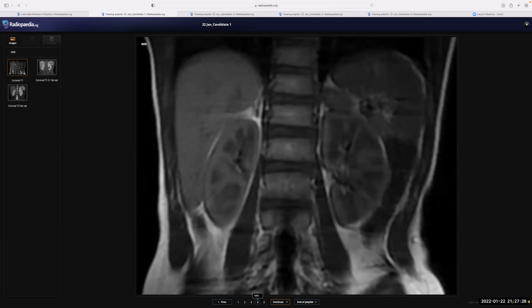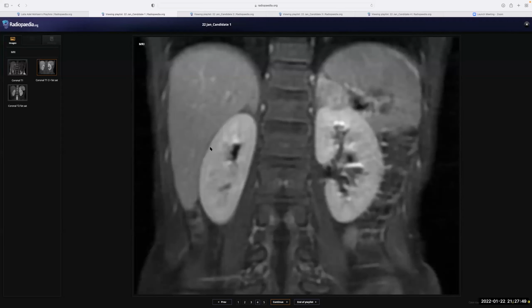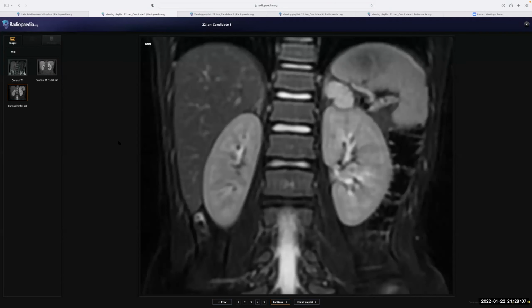Okay. So this was actually the question that I was going to ask. What are the syndromes associated with suprarenal masses? This is a pheochromocytoma, by the way. Yeah. Okay. So it is low on T1 and it is showing some enhancement on post-contrast. It is an adrenal mass which is showing enhancement, and can it be adrenocortical carcinoma as well? No, it is a pheochromocytoma. Yes.